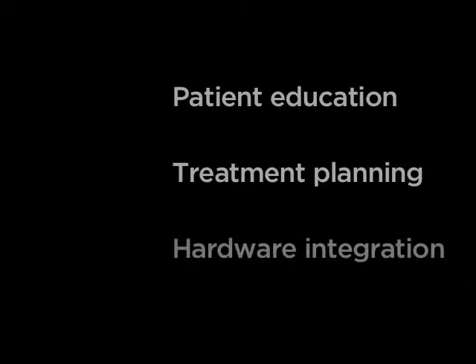But beyond just showing the patient what's happening, DMD lets dentists make a better judgment of what the problem is. The touchscreen interaction fits perfectly into the operatory, and staff love using it.